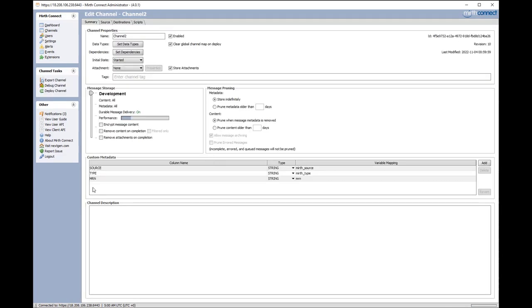So the next group is going to be the channel description. So this is pretty self-explanatory. We can set a description for a channel. So this is just a random description, and we can set anything in here. Note, if you set a description in your channel, you're also able to filter channels in the channel view.